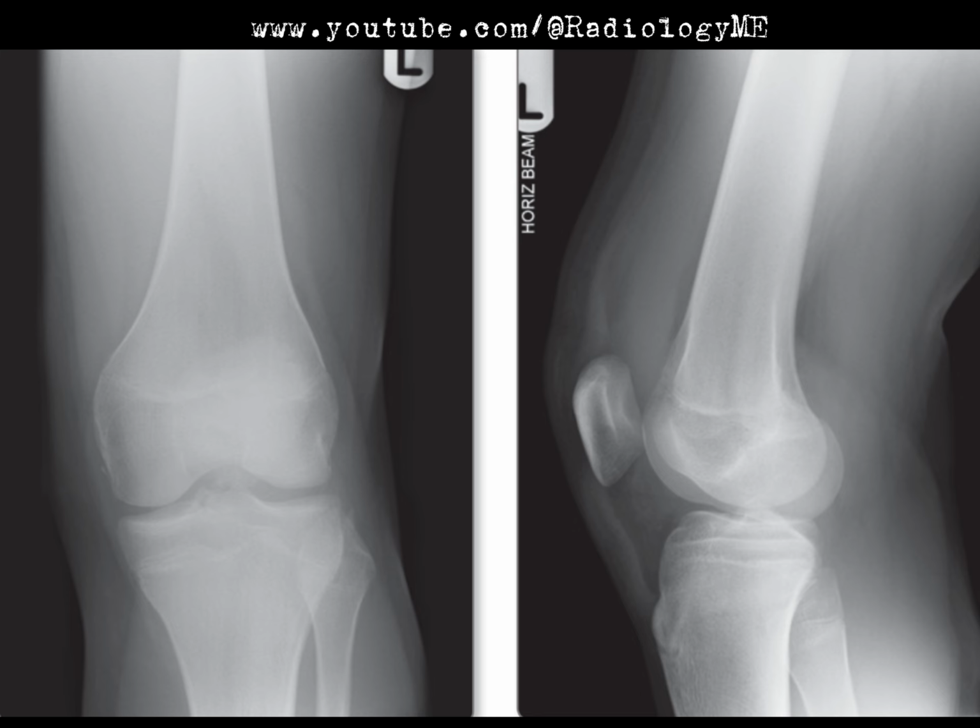So, based on all of that, the most likely diagnosis here is a Segond fracture. This is a type of fracture that happens when there's abnormal internal rotation and varus stress on the knee. It's often subtle on radiographs, but crucially, it's very strongly associated with injuries to the anterior cruciate ligament, ACL, as well as meniscal tears. So yeah, this is a big deal in terms of potential knee instability.